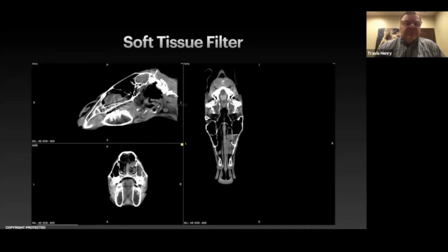And here's just another one where we can actually bring out even more of the soft tissues, where we've got a cyst laying in the ventroconchal bulla, and we'll talk about those a little bit later. But you can see the well-defined region that this can give us. But on the bone window, this kind of brings out more of the sinus architecture, where with this, we wanted to look specifically at the soft tissues. So just remember that you can look at different things based on how you set up the computer to show you these images.